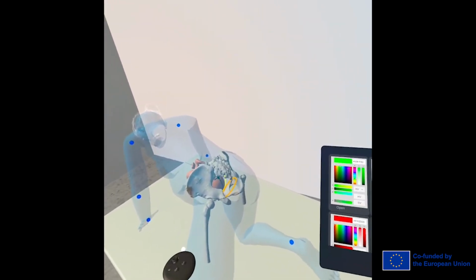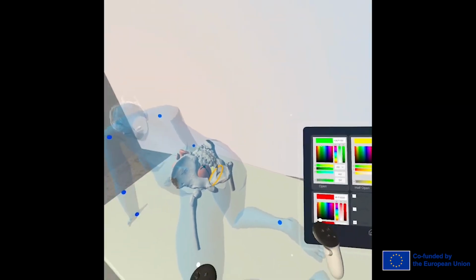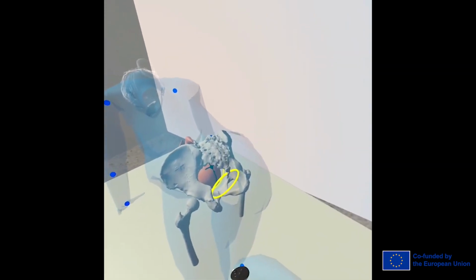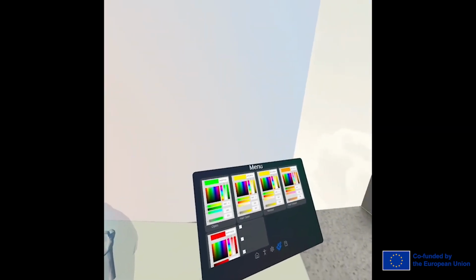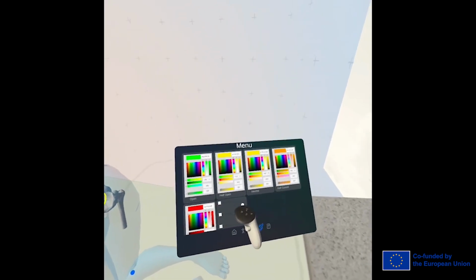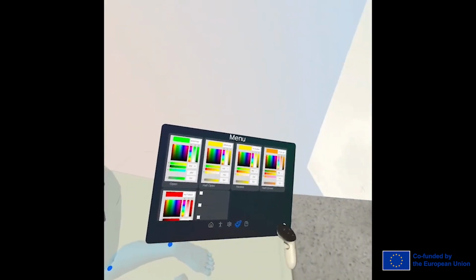So if the pelvic outlet right now is closing, you can see that it's going towards the red, and if it would be opening, I'm going to exaggerate it, it's going to be going closer to the green color. You can redefine these colors. You can see this is open, half open, neutral, half closed, and this one would be closed.